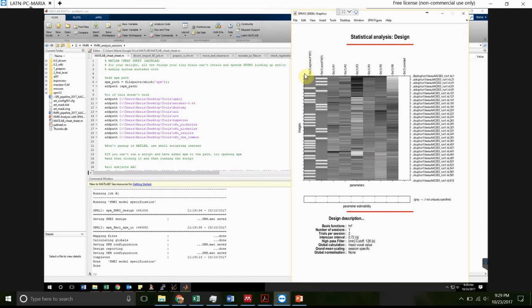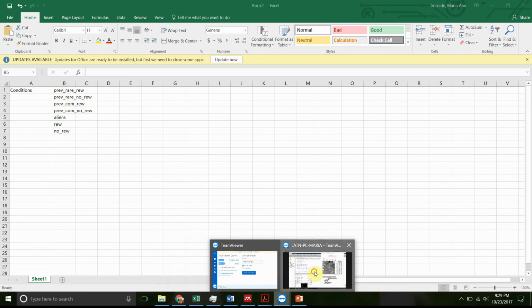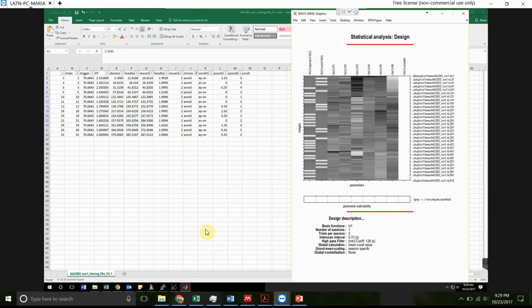So you can see here where we modeled these approach decisions. You can see when these occurred over time. So if we look along here, these are our scans, our individual volumes of data that occurred over the scanning run. It was from 1 to 612 volumes. And then you can see that this is when the approach decisions happened, which are the values that we copied and pasted from our Excel file, those onsets, and similarly for avoid.